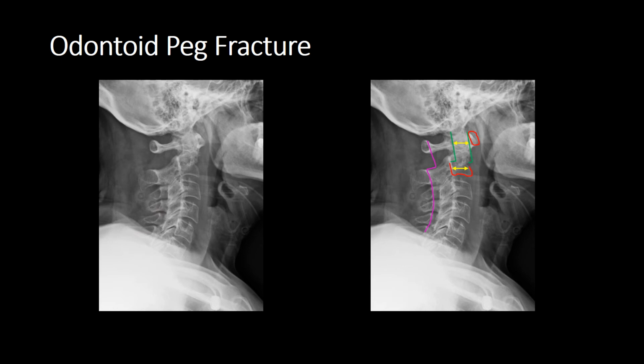Okay, so now we're after C for cartilage. Intervertebral disc spaces are looking really good. Let's check our facet joints. Well, they're kind of narrowed, but they're very sclerotic, so that's due to facet joint arthropathy. Check our interspinous spaces, that's all normal. There's a widening of the C1, C2 interspinous space. Okay, so we can see we've got a fracture to the base of the peg.